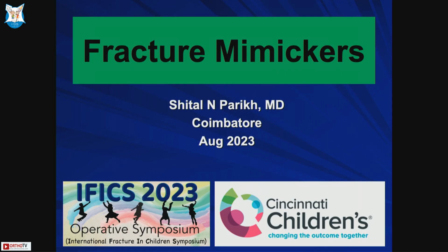So the first talk is on fracture mimickers. These are the x-rays that you might see and sometimes get consulted upon or get confused whether there is a fracture or not. So you just need to look at these x-rays. There is no need to take any notes. This is just like an atlas. You just go through the x-rays and see what appears to be fractures, but actually they are not fractures.